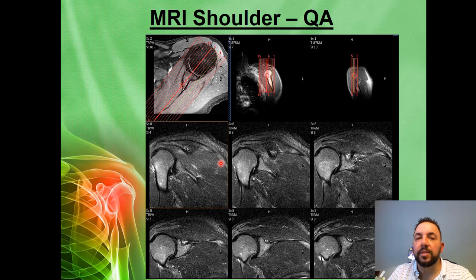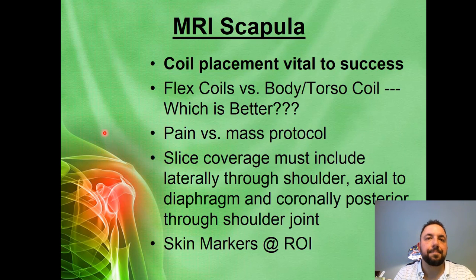How do you know? Now this medial aspect of what should have been the left shoulder is now indicated as the posterior portion. We have tipped the image too far past 45 degrees, so that instead of encoding oblique slices with a YX gradient combination, anytime we exceed the 45 degree cutoff, it becomes a sequence encoding gradients with an XY gradient combination, X being primary, and the images flip, giving the appearance of the opposite shoulder. Again, we always want to be mindful not to exceed 45 degrees.